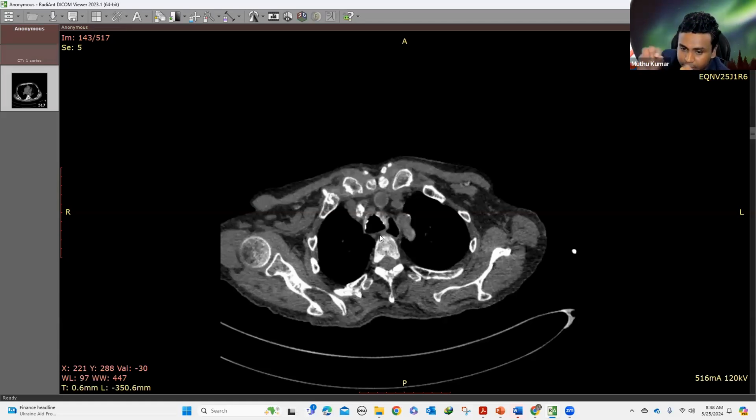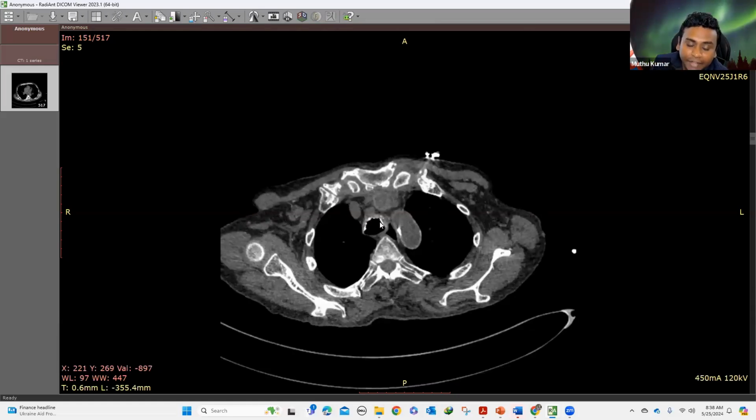It will be a rim calcification kind of appearance and will be associated with exuberant thickening, not exuberant calcification. In this patient, you are seeing an exuberant amount of calcification. The other thing you need to be careful about is when you see this in people more than 80 years old, just don't even mention it. Just leave it like that unless the patient has a broncholith within the airway causing airway obstruction.